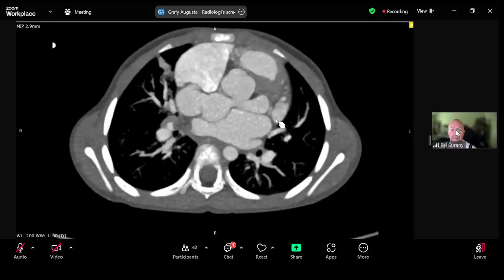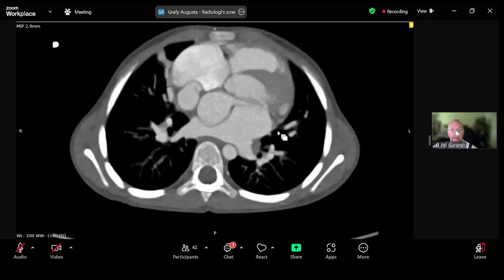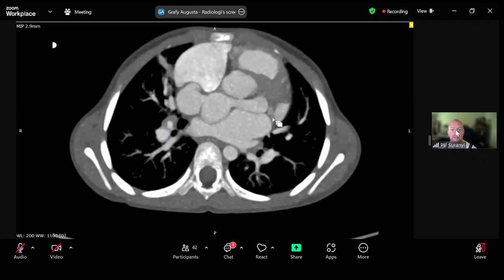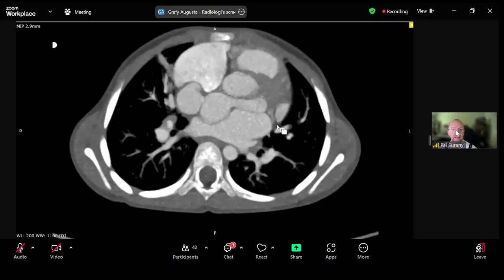It's really hard to see, but obviously that's where it would continue on. But you're absolutely right. This looks like an SA nodal, or sinoatrial nodal, artery. Some people call it different names, that has aneurysmally dilated.